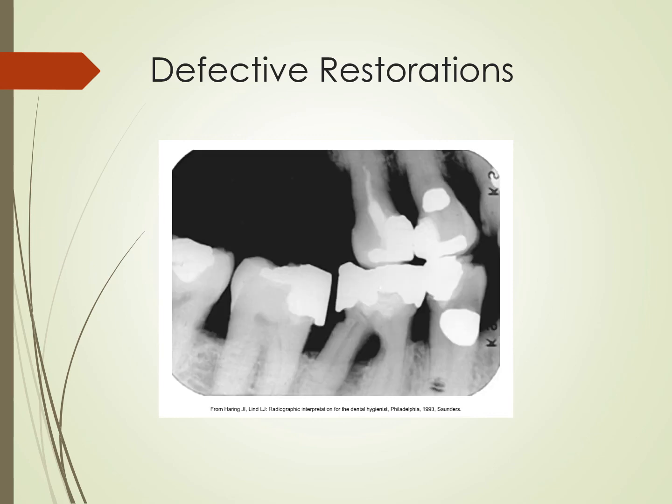Whoa, there's a lot going on in this image. So yeah, once again, we're seeing ADA severe periodontal disease, right? Severe, and there's a lot of fuzziness going on here in these ones. The contrast and density of this image isn't really that good. And this right here is our identification dot. We never want to forget about him.